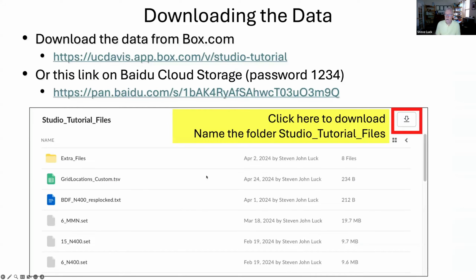Okay, to download the data, you could download the data from the ERP Core, but for this example, we're doing just a subset of the data. We've got 6 subjects, and they've been pre-processed a little bit already to make this easier. By the way, the analyses that I'm going to go through are sort of a simplified version of what you can find in the ERPLAB Studio tutorial on the ERPLAB website on GitHub.